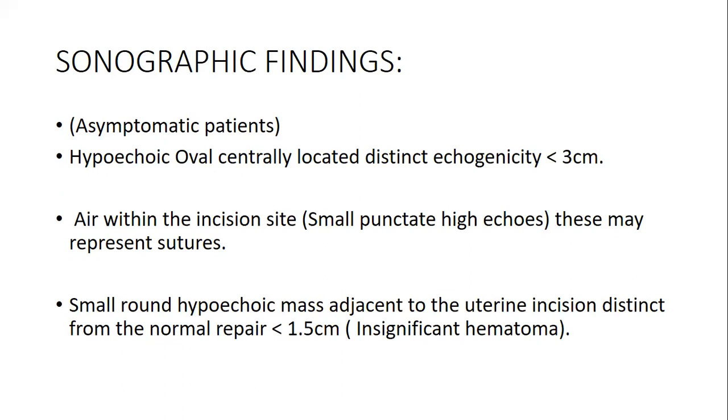That can be a normal site of incision. And remember, I talked about this. They use the sutures and they intertwine that area. So that may be a site of incision. Of course, you won't find it intact, given that that area was injured. So you remember there's healing, there was a bit of bleeding and stuff like that.